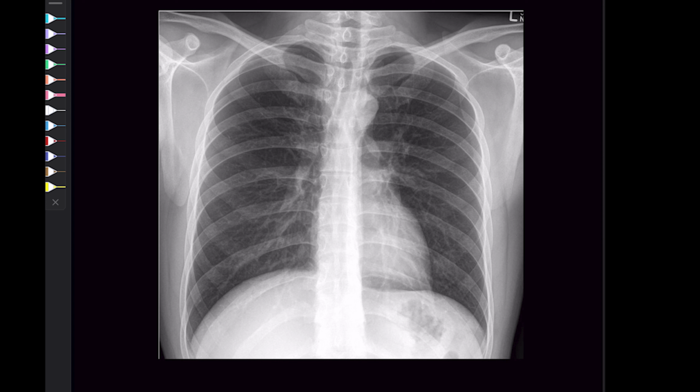Remember, if you're looking at this X-ray, you can see there is something dark black, something is a little bit grayish, and then you can see there are different shades of gray. Something is brilliant white. So these are so many factors. What are these known as? These are densities. And when you are approaching a conventional X-ray, there are 5 basic densities.